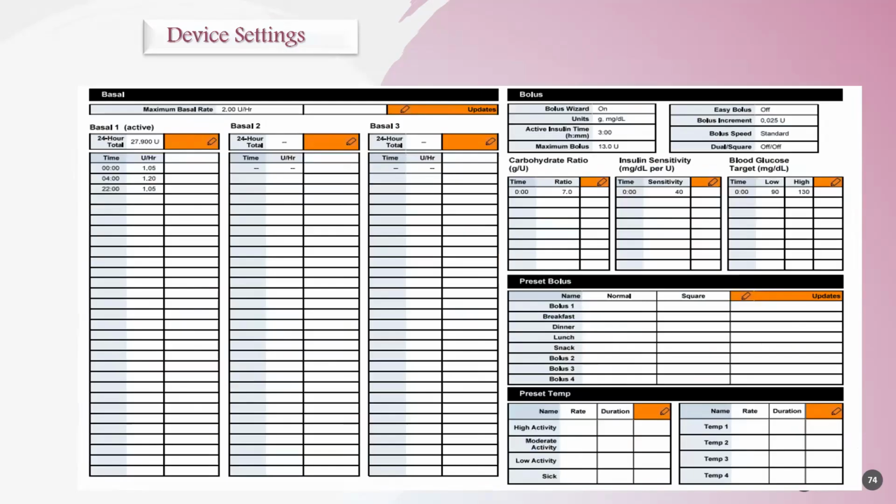Okay. Then, before analyzing the pump, I want to see the patient exactly. Which insulin is he on, and how much insulin did he take? Okay. Then I said I have to see this insulin regimen, this carb ratio. So I will go into the daily report and I will see what he did and what he missed.